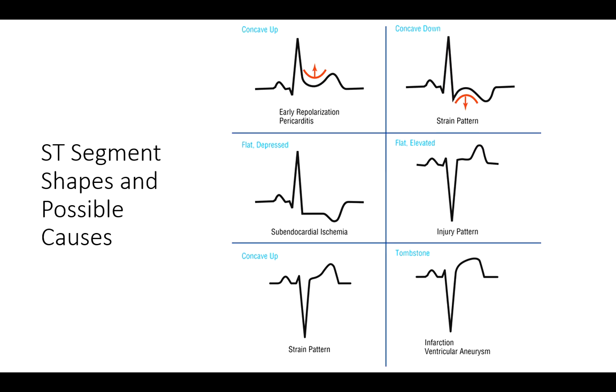Maybe it's because we did a poor job in placing the lead. Maybe it doesn't have good skin connection. The conductivity is poor. Maybe it's because we put it in the wrong spot. It's not getting a good signal or it's not getting a good picture of the heart because it's too high or too low. So be careful when we look at a single lead and a single rhythm about making these definitive declarations, because you really can't do that. You need a full perspective. But let's look at this.